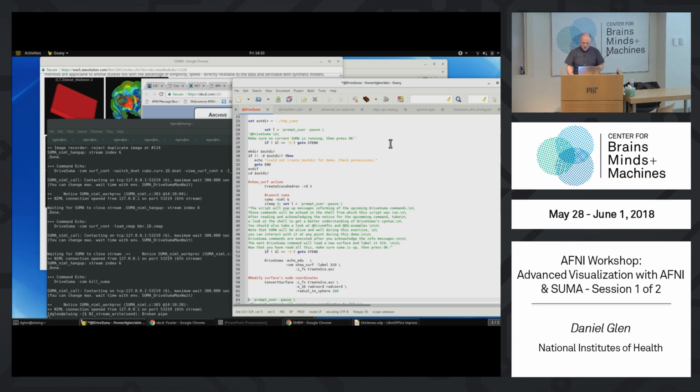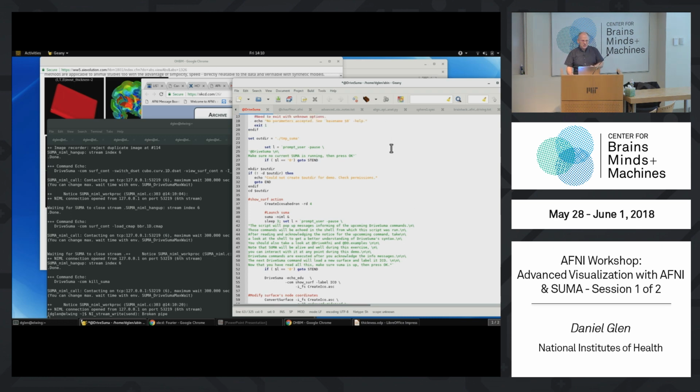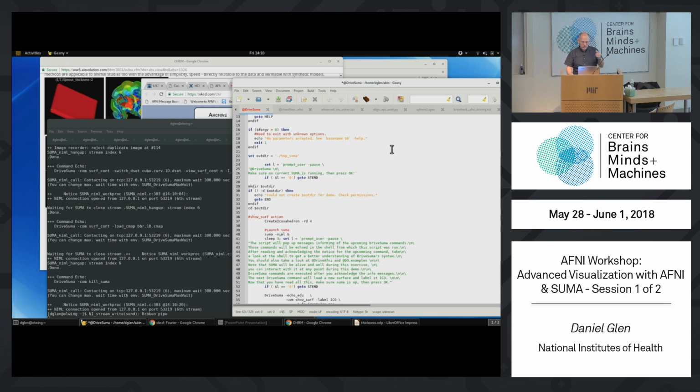Yeah, I remember there's one other sleep that has to happen. There's a prompt within SUMA, when it prompts SUMA to prompt, rather than a prompt outside. So that prompt has to have a sleep too, because that opens up a window in a similar way, and there's something that X11 doesn't like anymore. So, replaced. This is tricky at 2 in the morning.